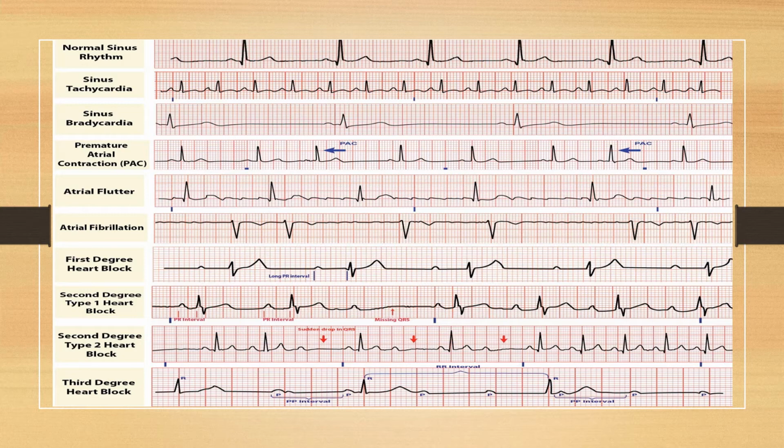Sorry about that. The next one, okay, it's irregular in time. So the pulse is all over the place, right? If we were to follow this pulse in terms of the QRSs, let's just do it. Beep, beep, and then a break. Beep, break, beep, long break, beep, beep. So irregular, right? So atrial fibrillation is always irregular. Okay, are there any P waves before the QRSs? No. This is atrial fibrillation, right? They need to be on an anticoagulant.